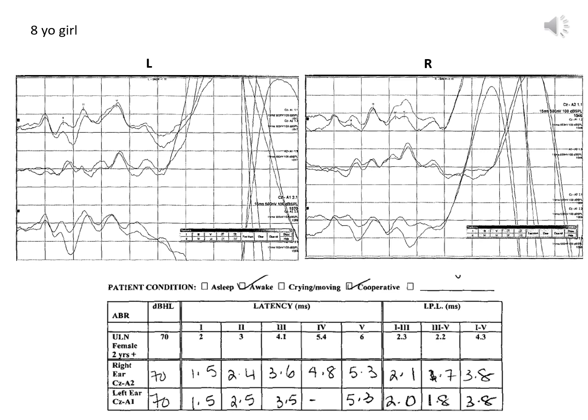When we go to the right ear, we see a clear 1, 2, 3, and then this is an example where the 4 and 5 are merged. And so the 4 and 5 actually form a plateau. And so it might be difficult to identify which is the 4 and which is the 5. And so it's helpful to go to the middle tracing where the wave 5 is most prominent. And so by looking at the wave 5, which is most prominent in the middle tracing, we can sort of track back up and identify the back end of the plateau, and the top tracing is the wave 5. And then again, the wave 1 is observable in the bottom tracing.